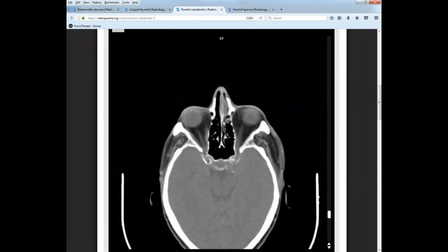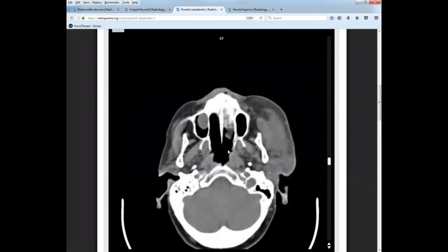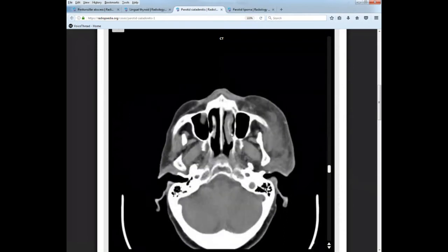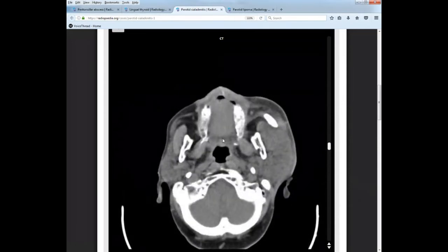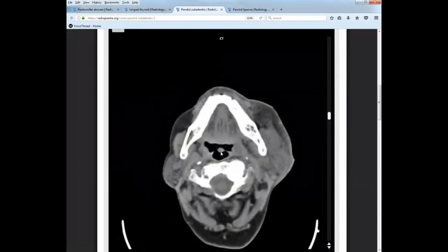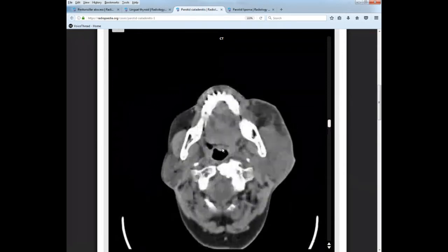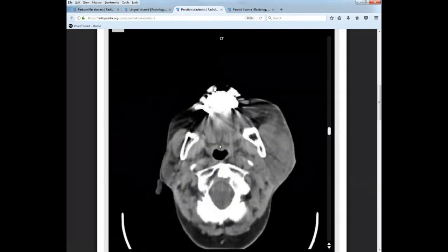Okay, we have traveling down your nasal concha. In here, nasal concha coming down. We're going to get hard palate and then soft palate. And then we're going to look in this area for like a little guy sticking out. That's your uvula sticking down into the back of the throat. It's attaching here, coming down. There's your uvula.